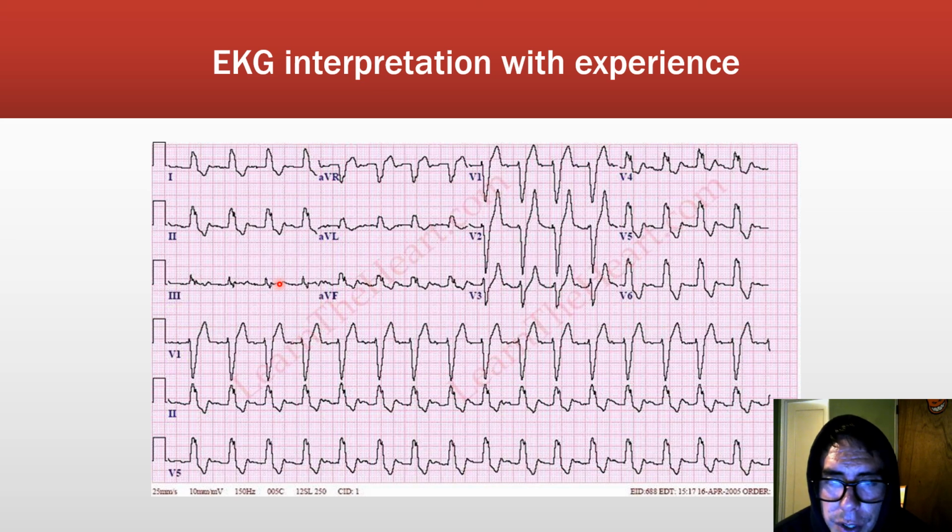So I'd call this a junctional rhythm at a rate of about, let's see here. There's not really any good ones. So at a rate of 100, it could either be a junctional tachycardia, or it could be VTach, ventricular tachycardia, although I'm not so sure about that one because it's usually a little bit quicker, even though it's on the cusp of what you could consider a VTach rate. But this is likely junctional tachycardia.